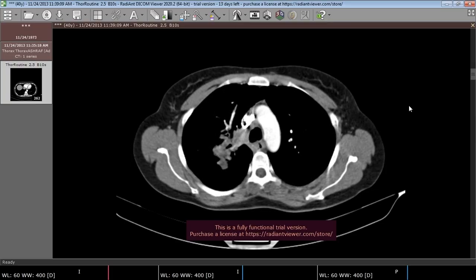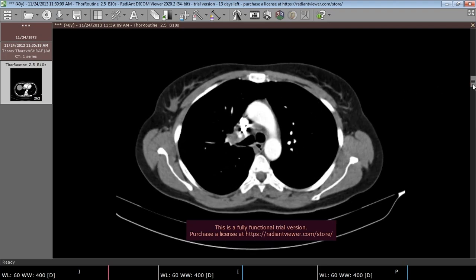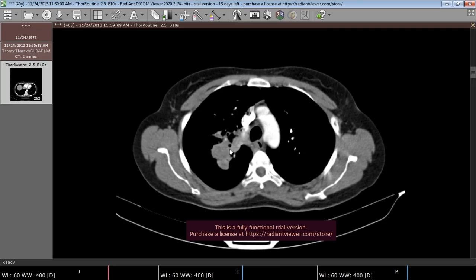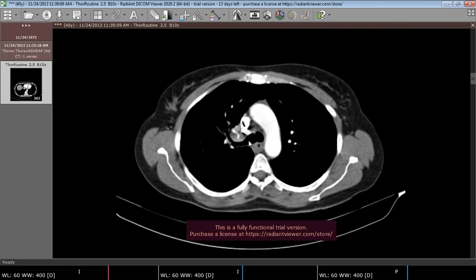This mass lesion also approximates the hilar region. You can see this component in the hilar region. If you can trace with me, there is communication between the mass lesion and these components in the perihilar location. It is abutting the origin of the upper lobe bronchus.